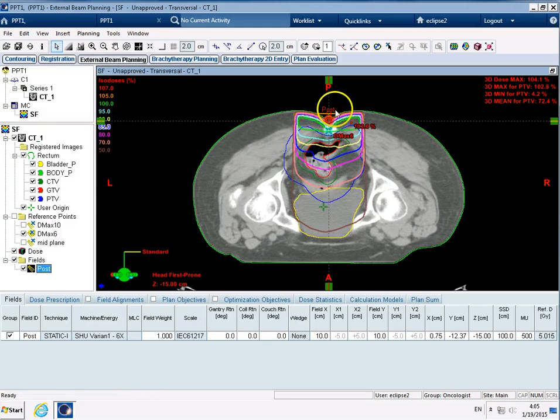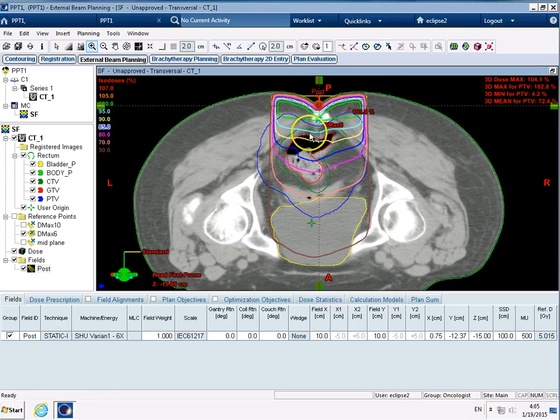Okay, so that's where the beam is entering the patient, and then I'm just going to zoom in a little bit more just around the beam. We talk about Dmax and we've looked at depth dose curves on the board in class. What I want to do is actually show you what it looks like on the planning system, to show you that it is the same thing.